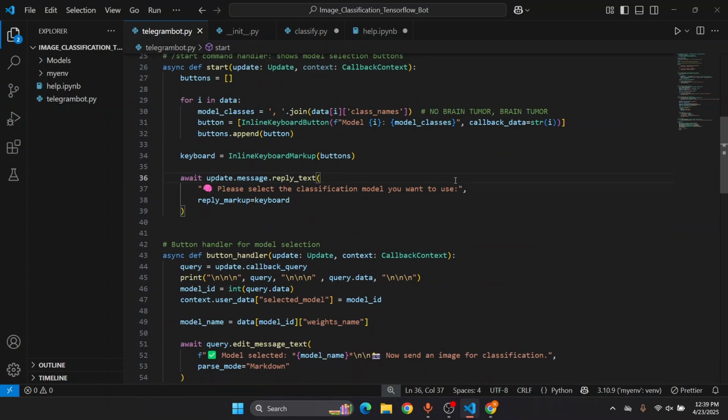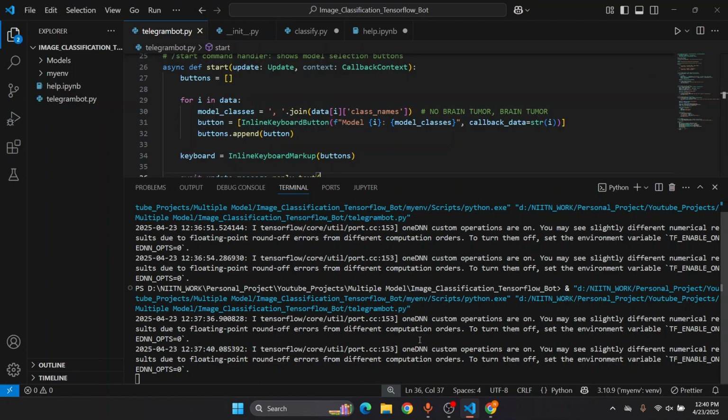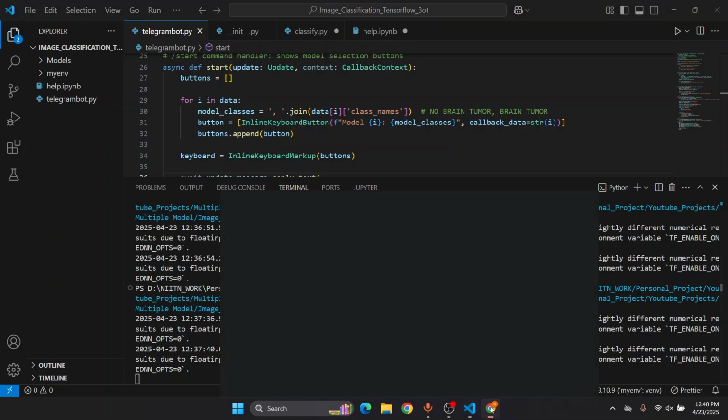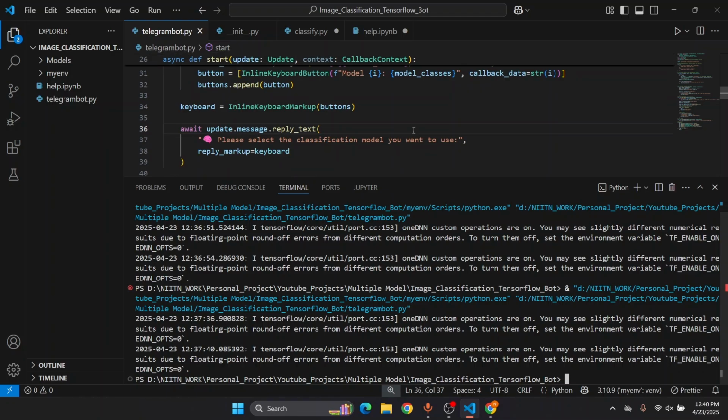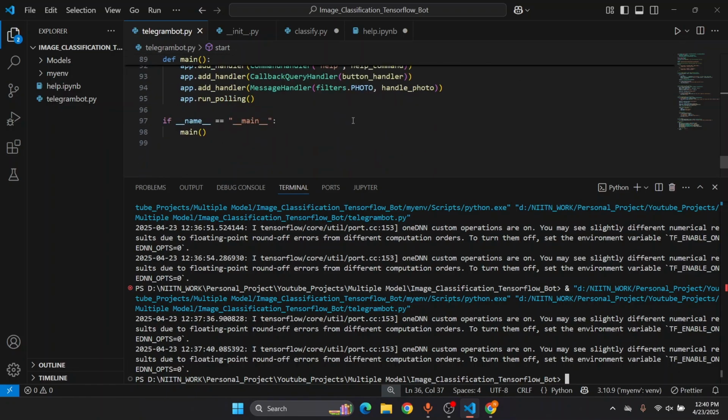Let me show you the result of everything here. So let me run it. It's working. Let me send the start command. Oh, I think, okay, I have not run it. Let me run it.